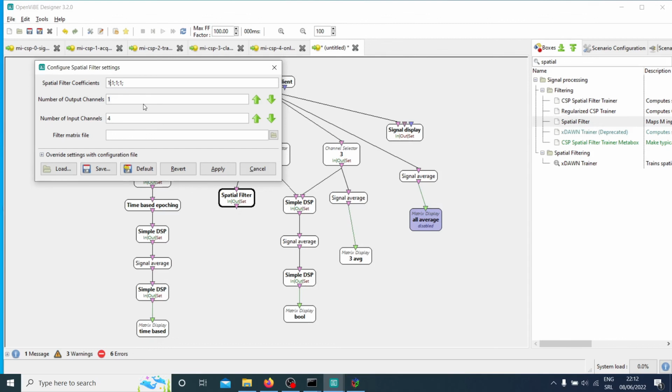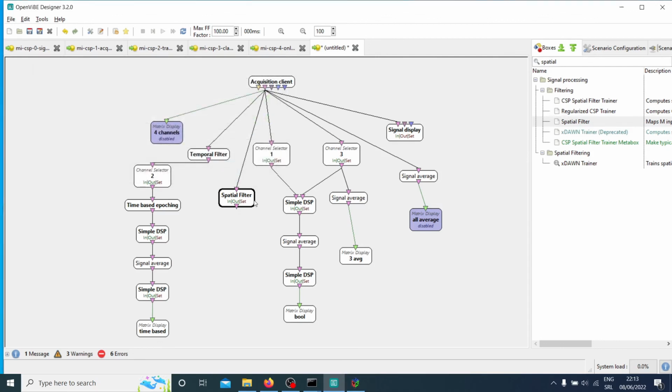In the same way, I can subtract the second one from the first, and for example, the third as well. You can play with these. You can say, I'm not going to use the last one, or I'm going to subtract this one too, or maybe I can just amplify it. Okay, I'm not sure if this works. Let me see. Spatial filter. Let me just debug this and see if it gives me an error. I have no idea.